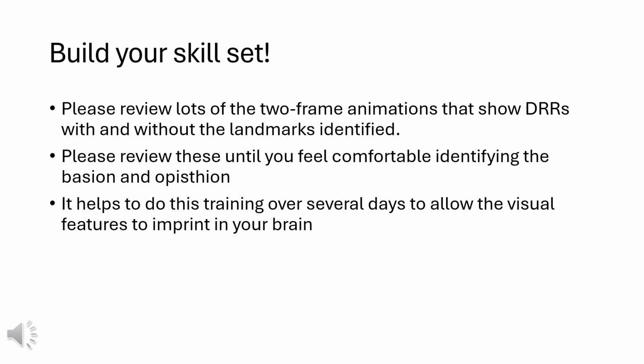With this knowledge base, and referring back to this video as often as needed, please review lots of examples of the two-view animations that show DRRs with and without basion and opisthion marked. Please review these until you feel comfortable with finding the basion and opisthion on lateral spine X-rays. It can help to work on training periodically over several days, as this allows the visual features to imprint on your brain. This type of learning curve or familiarity effect is a common aspect of skill learning.